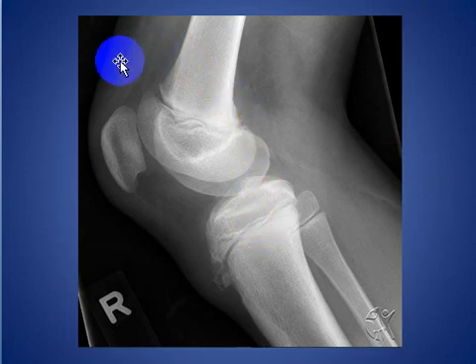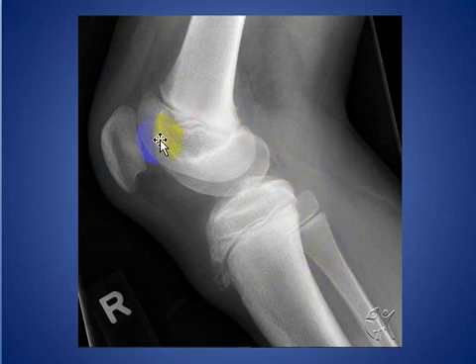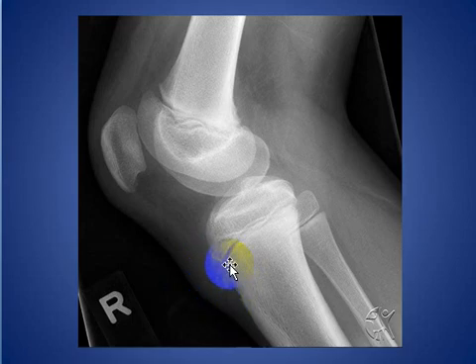Here, this is a lateral knee joint X-ray. As we see here, fragmentation of the tuberosity of the tibia associated with soft tissue swelling, and these findings are characteristic of Osgood-Schlatter disease. And on examination, there is tenderness over the tibial tuberosity.